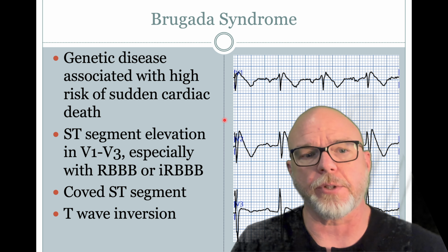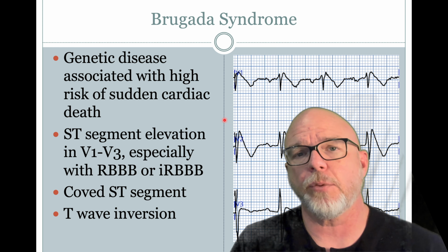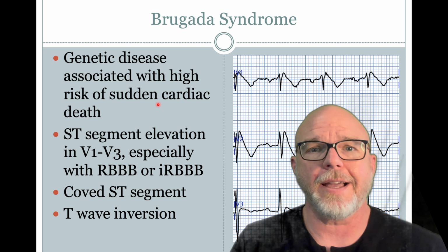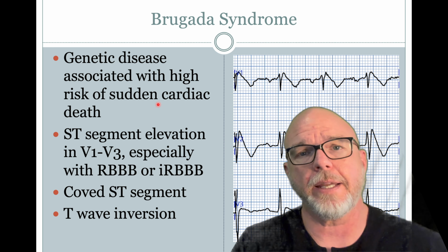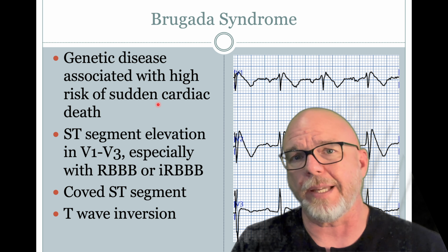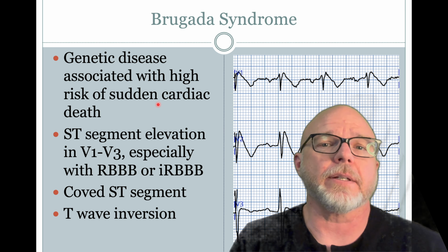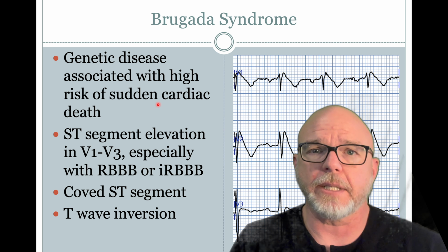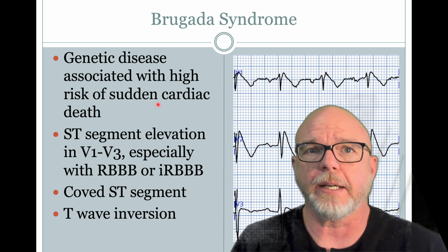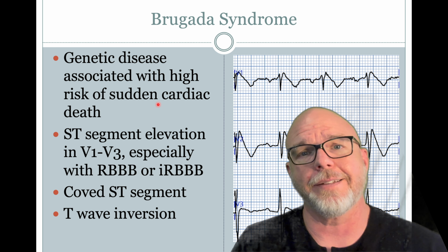That's Brugada syndrome. Brugada syndrome, just by the way, has a high propensity for sudden cardiac death. It's confirmed in an electrophysiology lab and is treated with an automatic implanted internal defibrillator, even in young people, like in their 20s, 30s, and 40s. So each time that there's a syncopal event has a potential for sudden cardiac death. And so this is something that needs to be recognized, and even that recognition alone can save a life.